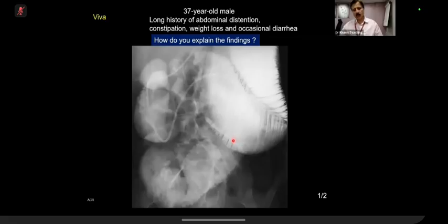Okay, very good. Now, let me tell you, scleroderma is a very, very, very important exam case, and in MSK, you remember we did a lot of scleroderma for calcification and things like that. And similarly, GI involvement films come. Please remember that GI-wise, the most common organ is esophagus, but films-wise, they will not show you. They will show you enema, which is very common, where you will see sacculations in the transverse colon, etc. But in small bowel, two types of findings can be seen.